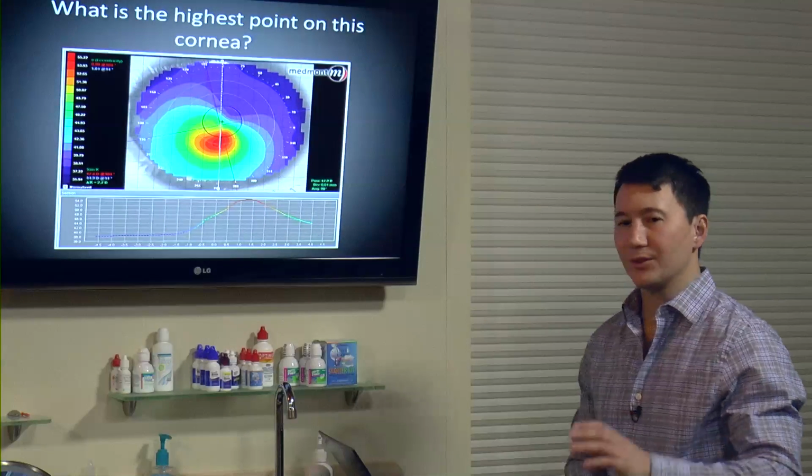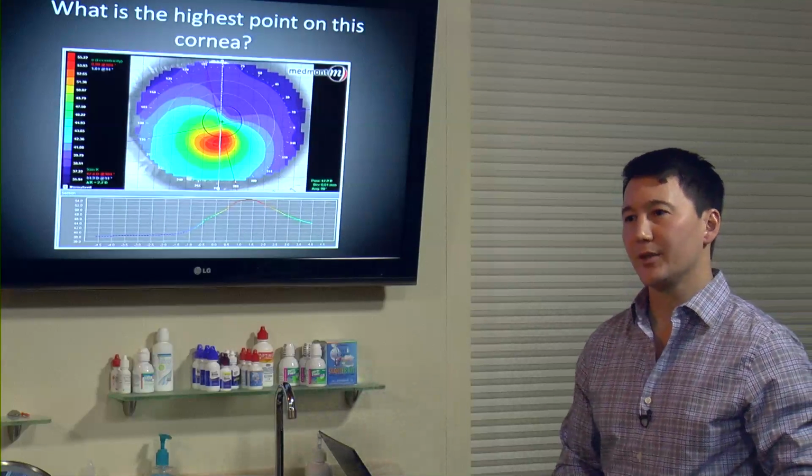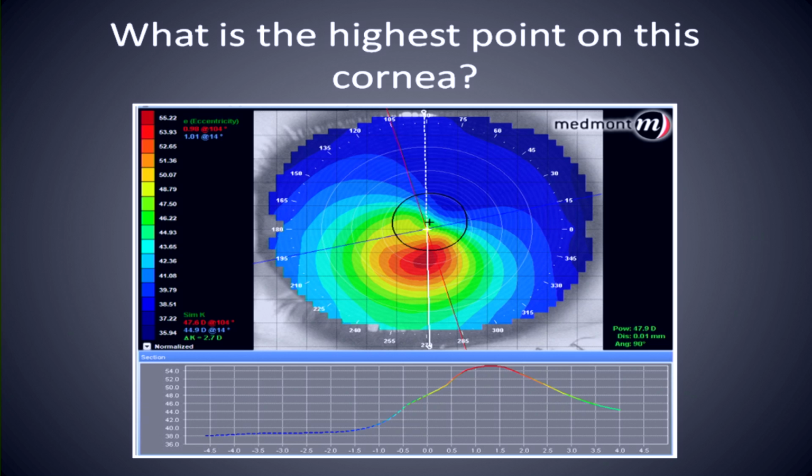So here's a question. This is something that it's taken me a long time to understand, and the team at Pacific has been real helpful in helping me to understand it. If you look at this eye, what would you say is the highest point?